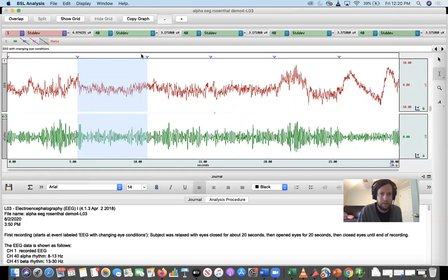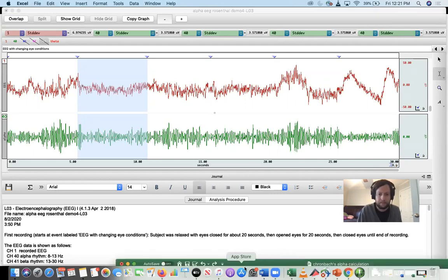So this is an eyes opened trial. The amplitude is 3.5718. Right there, 3.5718. You would take that number, that's the alpha amplitude for the first trial, which was eyes open, 3.571. We'll round it to 3.572. And then we'll go to the Excel spreadsheet.